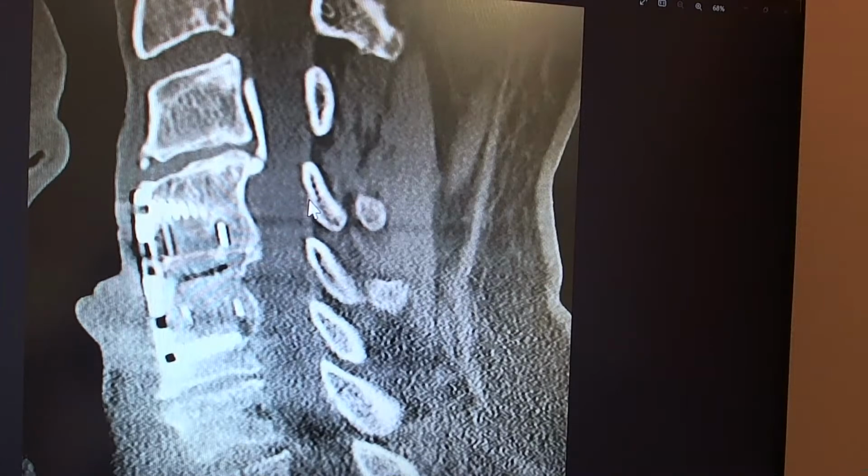And this is one of those pictures that we have discussed before. As you see here, this is the trachea. Esophagus you wouldn't see. You see the very dense metal. This is titanium, and you see the pins, metal pins, in a PEEK or plastic cage.